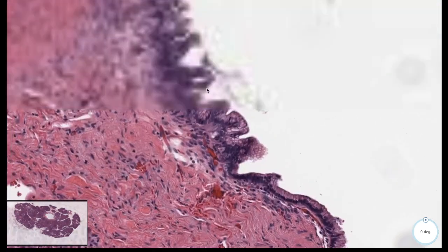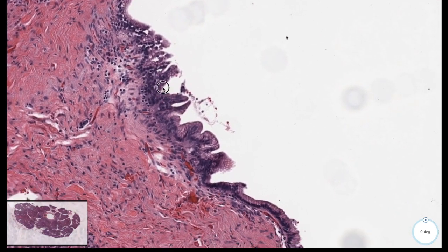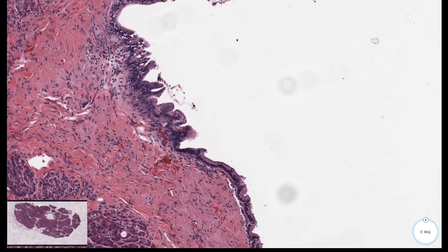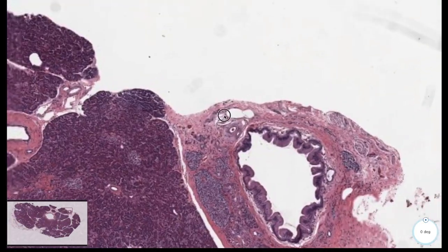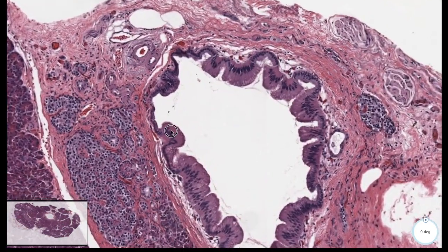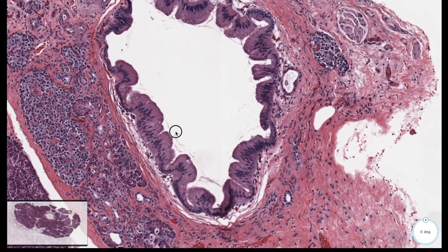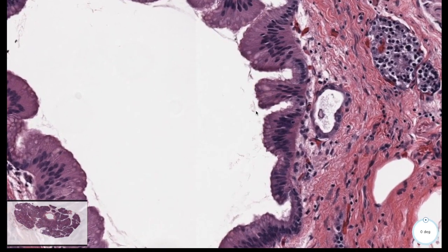Each cell is respecting each other; maybe right here they're clumping on top of each other, but generally, for a dysplastic pancreatic intraepithelial lesion, there's either low grade or high grade, and here we're seeing more of the low grade components. Very orderly. Nuclei are very on the basal surface. The apical cells are producing mucin. Okay.